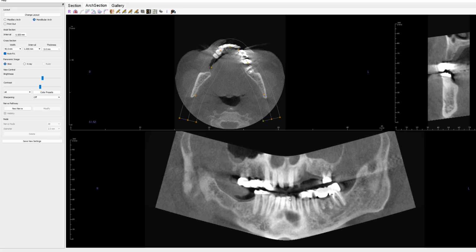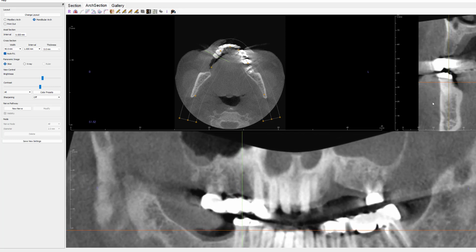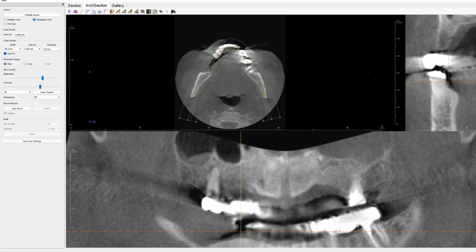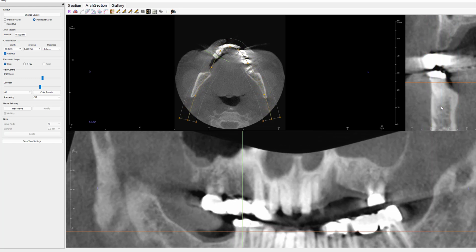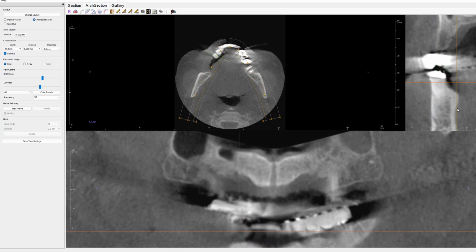I've told my students I spend a lot of time looking at this because dental disease is so common. I'm going to enlarge this. And so my maxillary teeth occupy most of that screen right there. It's nice and enlarged. I have a big screen and I can see everything. Scroll from the buccal into the palatal. And you can see I clicked right here on this vertical section, which is the curved slice that I'm looking at right now. I'm no longer looking at a panoramic reformat. I'm looking at the curved slice going from the buccal to the palatal.